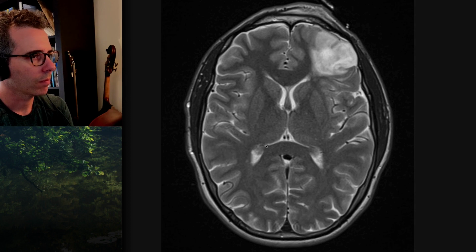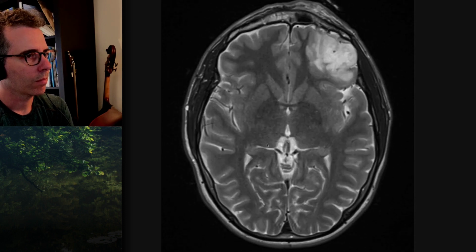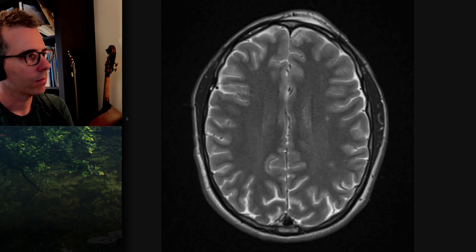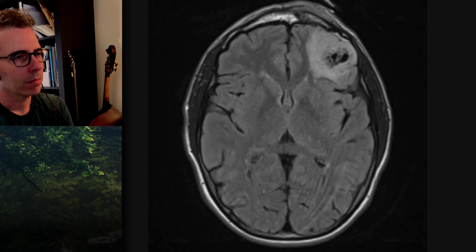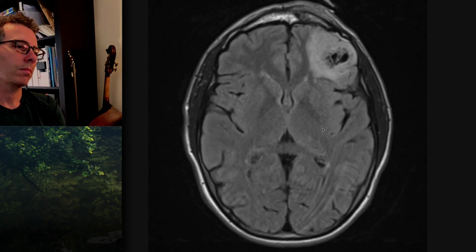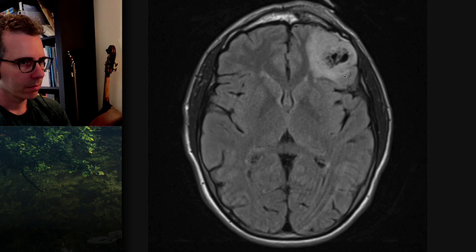It is associated with local mass effect, as noted on the CT, with effacement of the sulci overlying it. We'll now look at FLAIR. Within it are some areas of suppression centrally, but peripherally it has a relatively homogeneous thick rim of increased T2 FLAIR signal relative to both gray and white matter.